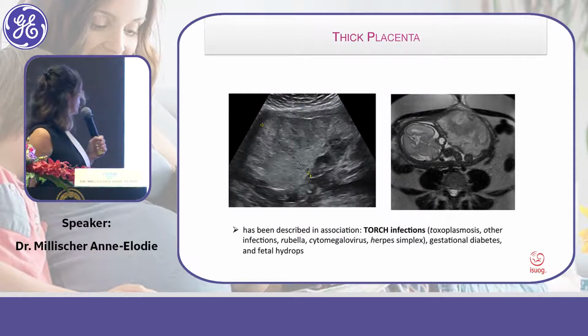But sometimes we see this kind of placenta, a very thick placenta, heterogeneous, with kind of hyperechogenicity inside the placenta.